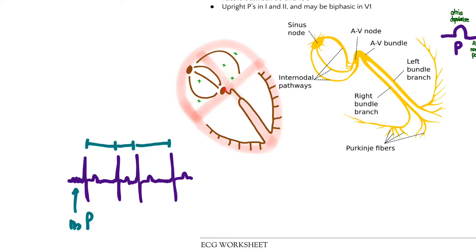It's meandering slowly through the rest of the heart. And some of them are really close, like this one. And so we have this irregular beat here. I'll write it up here, actually. It's irregular. So no P waves, and it's irregular.